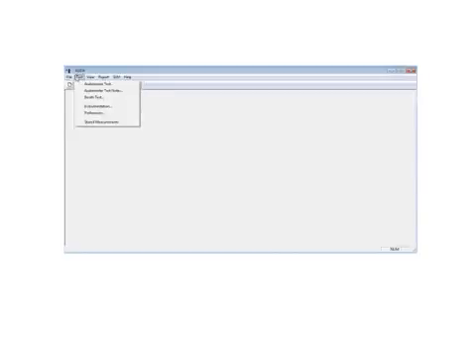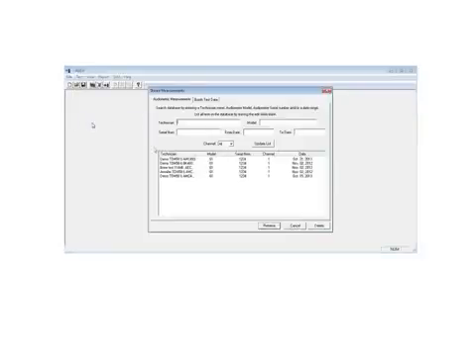And as a part of the equipment setup, you enter in all of your instrumentation. So the Model 824 meter and its serial number and calibration due date, along with the preamplifier, the microphone, the calibrator. These are all entered into the database and tracked with the audit software on the PC. Once that's all entered and you're ready to make a measurement, you can just tell it to go ahead and make that measurement. We'll bring in a demonstration measurement for today by retrieving that measurement.